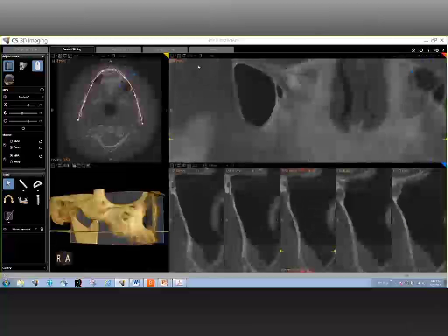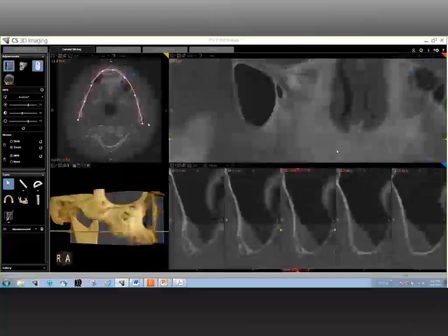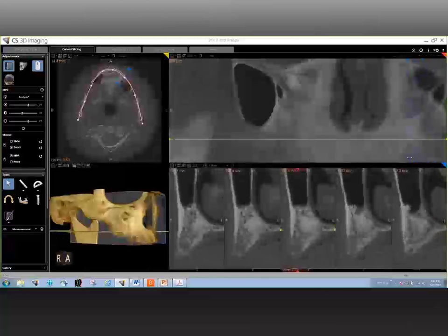Now, if you go to the contralateral... I'm sorry, Jordan. Go ahead. I just noticed something as you were scrolling through there that I wanted to point out. Does the bone look different on the contralateral side? Keep going. Right here. You are correct. You have good eyes on that.